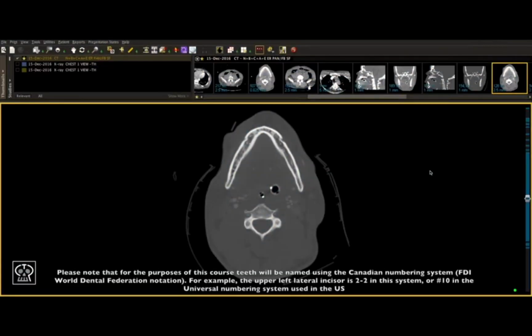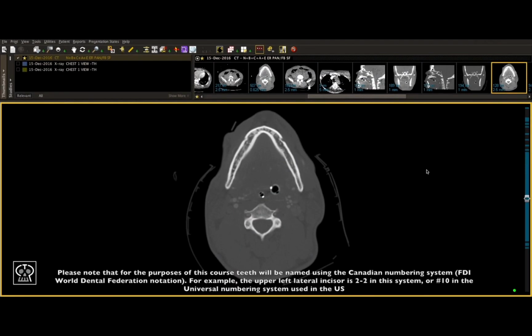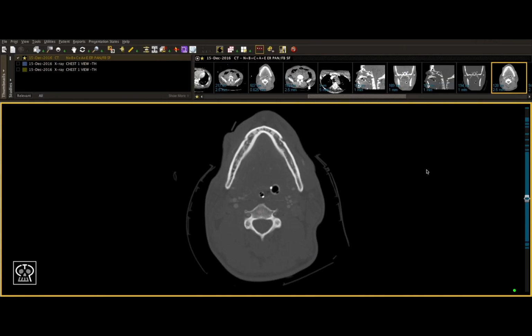Now that we've gone over the basics of analyzing the maxilla in all three views, let's go over some examples. Before we start with our first example, I just want to highlight a point that I made in the basics of CT scan interpretation video. Remember, I always said to look for the cuts on the scan that you're looking at and to make sure they're as thin and as low as possible.